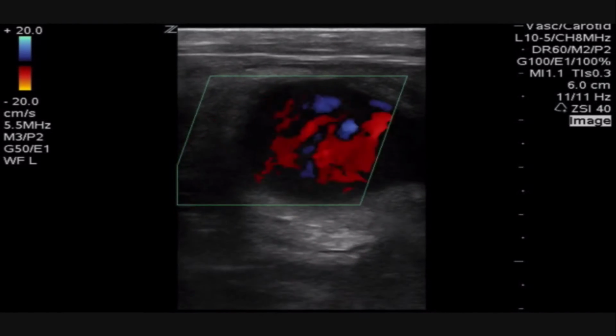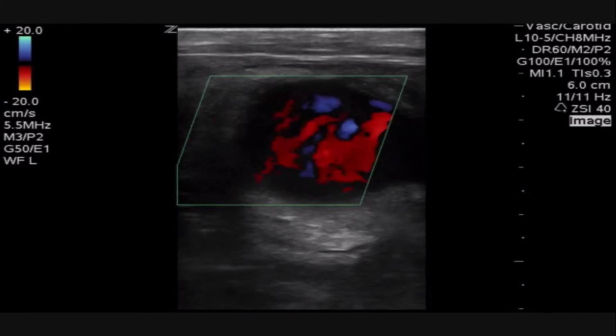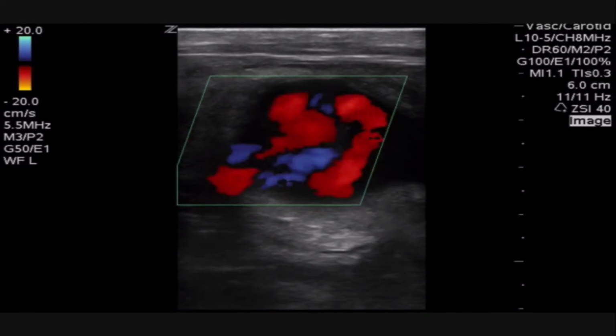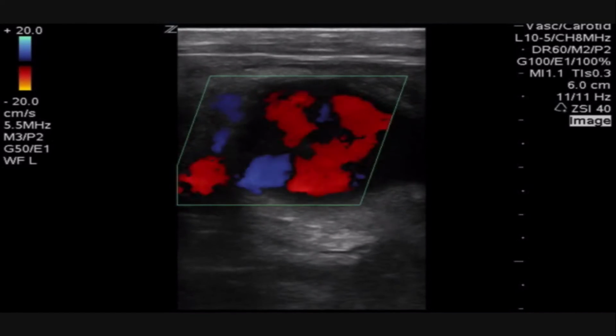And then you think about your differential diagnosis, which is basically between an AV fistula, pseudoaneurysm, or aneurysm. Now, AV fistulas typically occur with penetrating trauma. This patient's trauma was blunt, therefore pseudoaneurysm seems more likely.